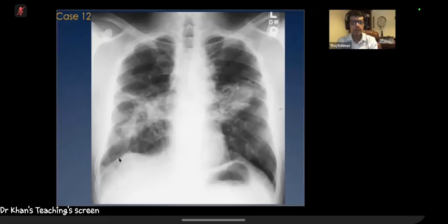It just pulls the diaphragm up. There is no reticulation at all at the bases, and the basal volume is not reduced. You did say that the lungs appear hyperinflated and emphysematous. So when you say the rest of the lung is hyperinflated, how can you put IPF in the differential? How can you put interstitial fibrosis?